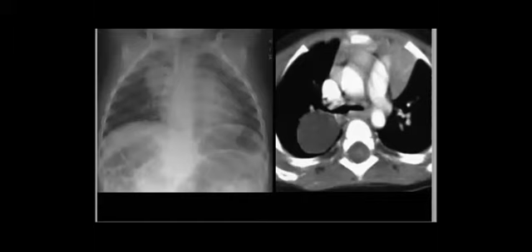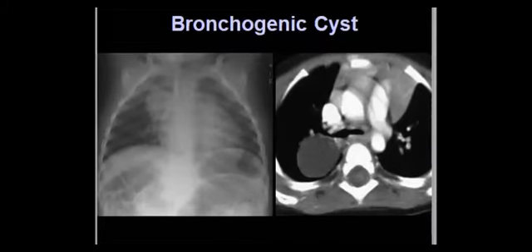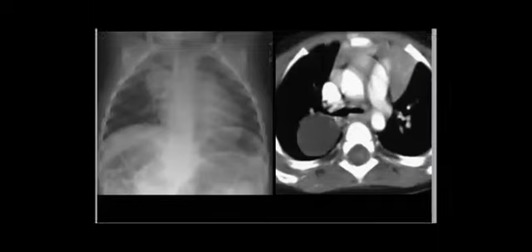And so, to go quickly, this is what is called bronchogenic cyst. Yes, bronchogenic cyst. So as you mentioned, if it is mediastinum, there is no obscuration of the cardiac silhouette. Okay, so it is an intrapulmonary bronchogenic cyst. Perfect.